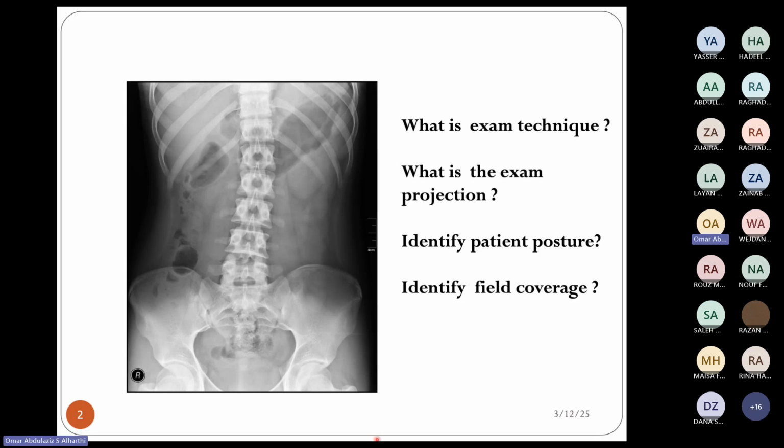What is the projection here? It's anterior posterior. Okay, so it's AP. What is the position or posture? Supine. Okay, excellent.